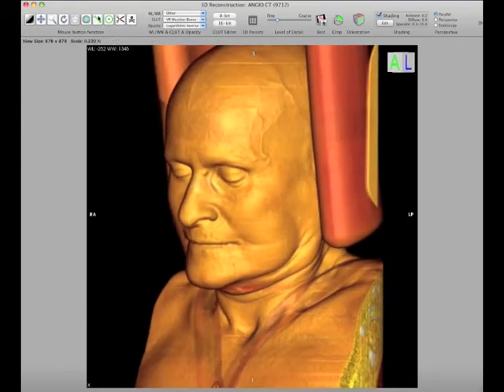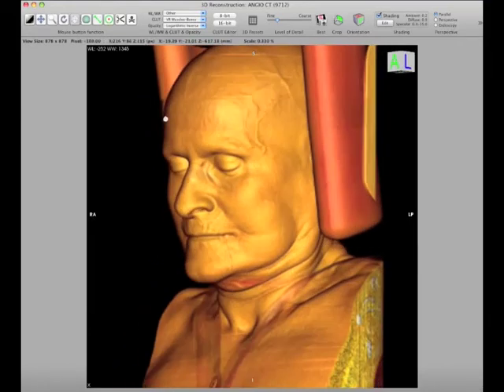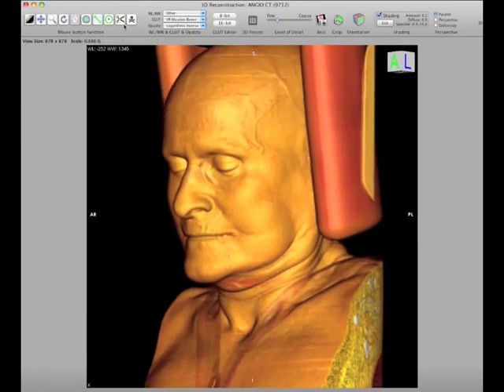I don't use this tool. This is your measure tool again, but you really don't want to use it because it's not going to be accurate in this view, or not as accurate. So please do all your measuring in the 2D view.